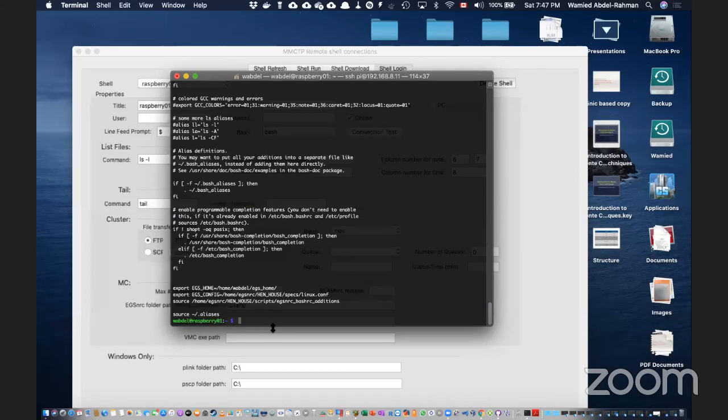If I don't have this configuration, I need to update the henhouse in my home directory, in the mmctp home directory, in all users' home directories. Each one needs to do that separately. But if all of them are using henhouse from one folder, I just need to update that. All the users need to do is recompile their user codes. That's it.